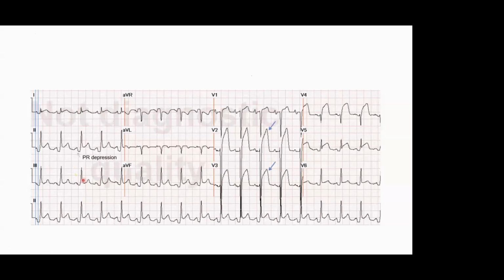It's not pericarditis. Some STEMI will also have associated pericarditis. This is the way you have to find out the MI with pericarditis. Okay, it's a case of MI with pericarditis.